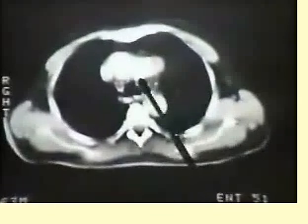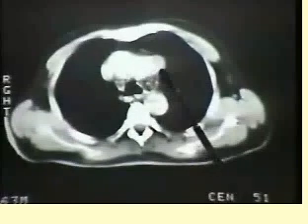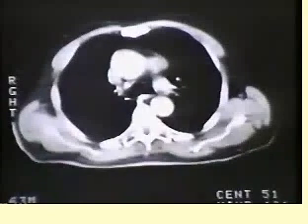Notice this little accumulation of small densities between the ascending aorta and the descending aorta. And we see that there is a round shadow sticking out of the side of the aorta with a defect in the wall here. This represents a small aneurysm. Let me show you the adjacent cut. Below that, there's the aneurysm displacing the pleura.